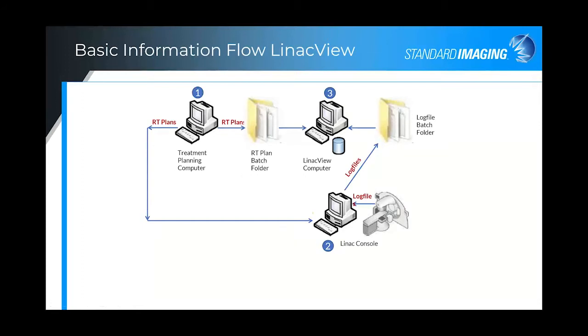Here's the basic information flow for LinacView. The RTPlan is exported from the treatment planning system, both to the LinacView computer, as well as to the Linac console. For any plan already imported, LinacView automatically matches log files that are synced from the Linac for comparison to the plan and analyzes numerous parameters.